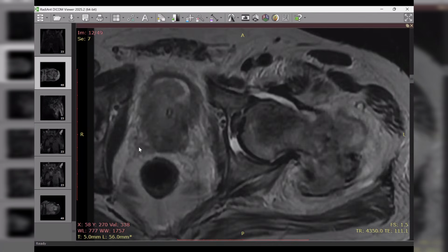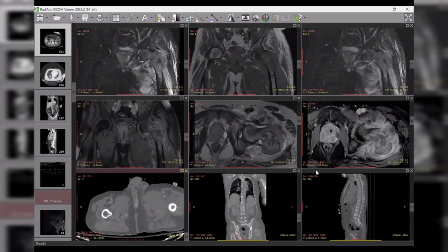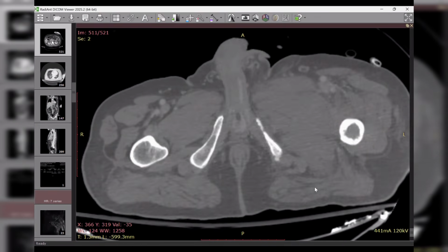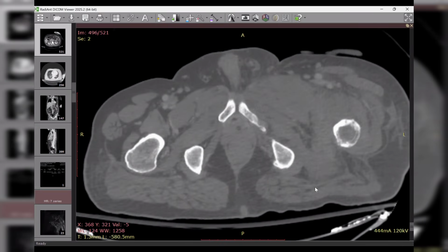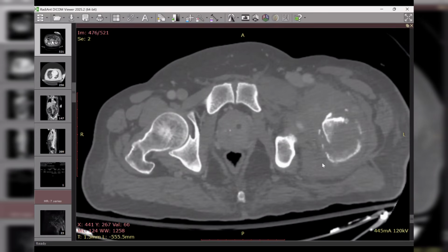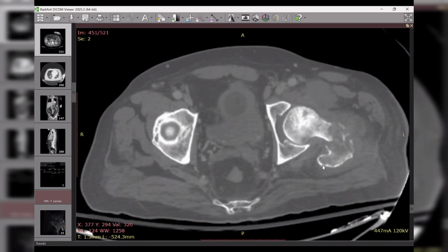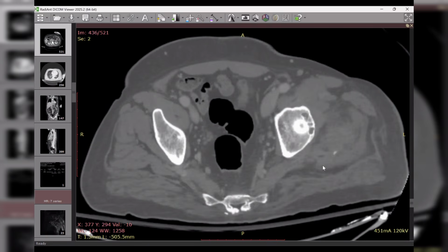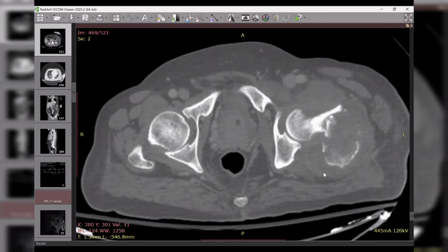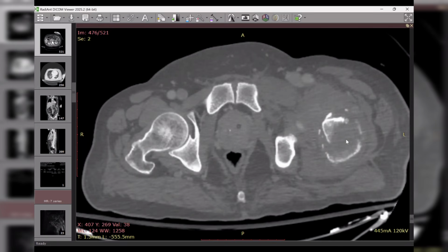I want to share this one with you. You can comment. Okay, it's a CT scan, bony window, showing pelvic bony structures. There is a destructive osteolytic lesion. This upper one is the lytic lesion of the left femur. Of the left femur, yes.